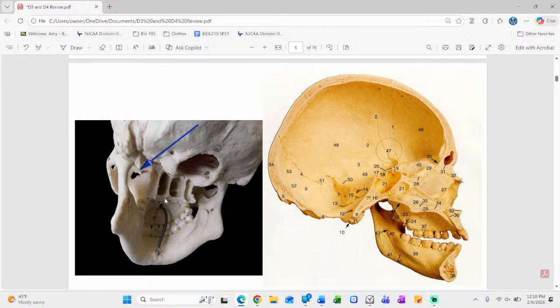And of course, what bone are we on here? Sphenoid bone, right? So there's your sphenoid bone from underneath. Because what do we have? That little pointy guy right here. There's your hamulus. Off which pterygoid plate? Medial. All right, so there's important stuff there.